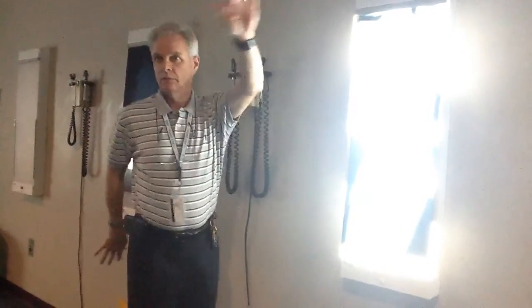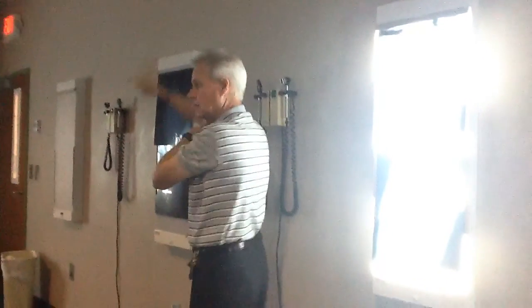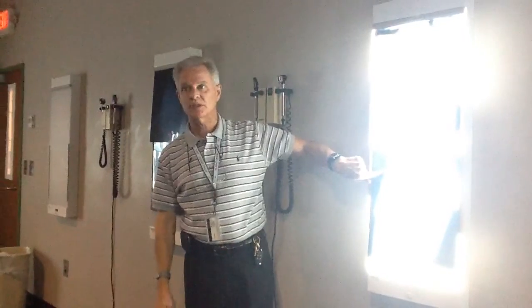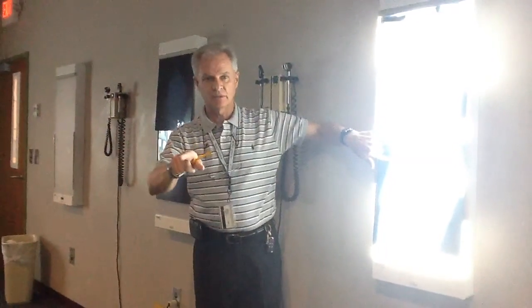The lung is under that shoulder. It doesn't switch unless we turn them all the way around past 90 degrees, and we don't do that. So, PA, LAO, RAO. That's just the swim position of the arms to get them out of the way. The shoulder laterality doesn't change. You see that? So this is still the right shoulder, which means this is the right lung we're seeing. And oblique views are contralateral. LAO right lung, RAO left lung.